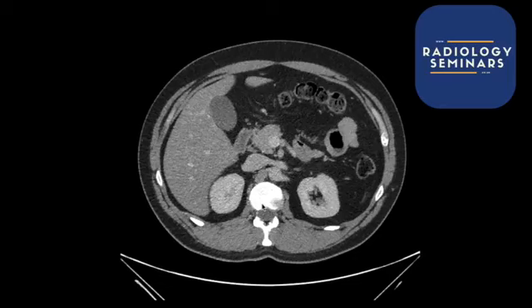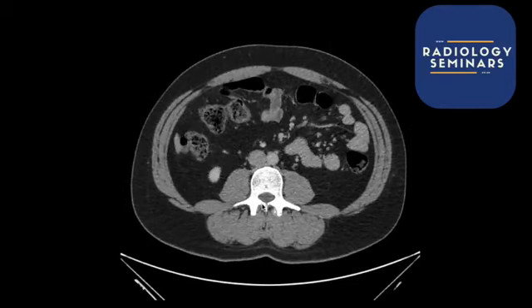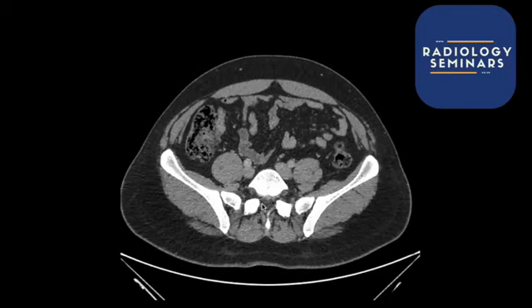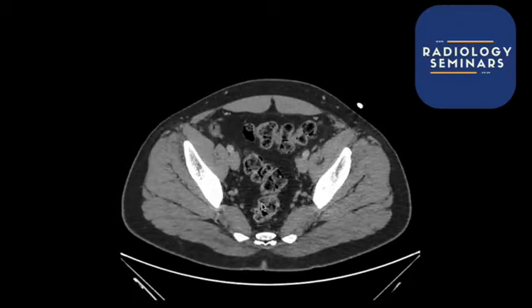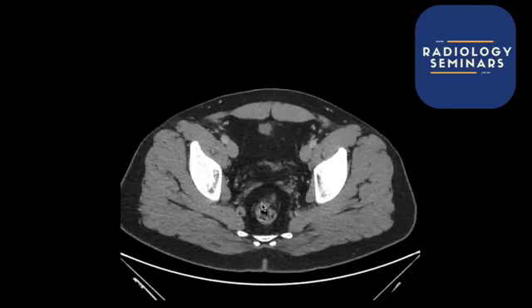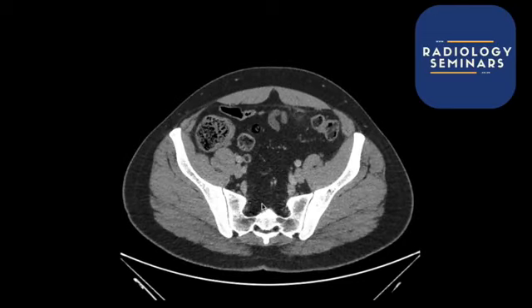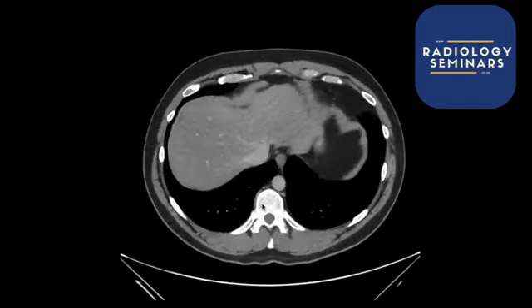So I'm going to go down this, and maybe some of you might be able to see the abnormality. Yeah, I know I'm really meant to be giving you a normal scan with nothing on it, but I couldn't help myself. I had to keep you guys on your toes, try and get you to stay awake, for those of you that are already quite versed in CT.